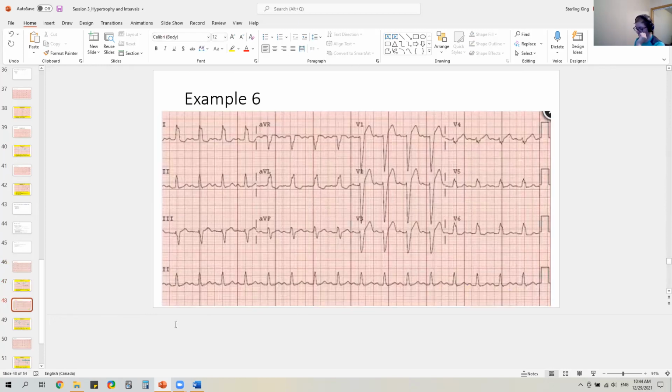All right, next example. Go ahead and take a quick pause to work through it, and then I'll start over here.